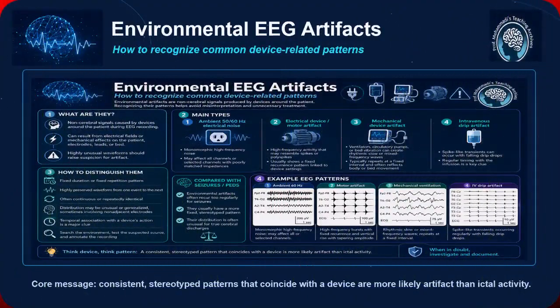Welcome, everyone. In this presentation, we will explore environmental EEG artifacts, patterns that appear on the EEG but are not generated by the brain. These artifacts are often produced by electrical or mechanical devices around the patient during recording.